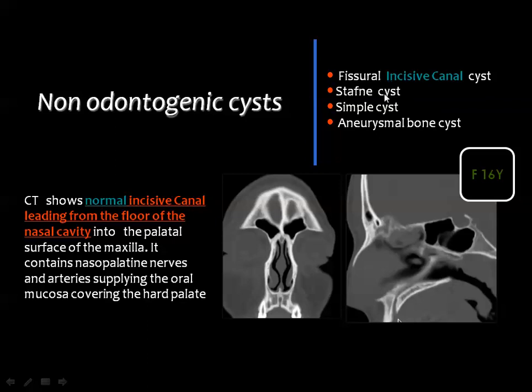The incisive canal is this canal which is leading from the floor of the nasal cavity into the palatal surface of the maxilla. And you see here, this is the incisive canal in the sagittal image, and this is the incisive canal in the coronal image.